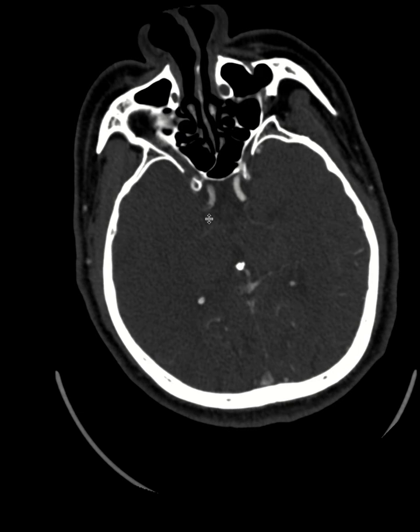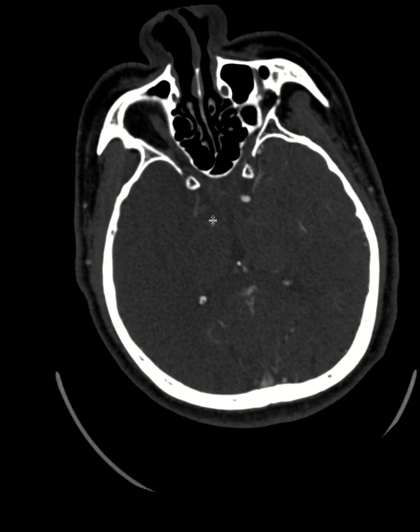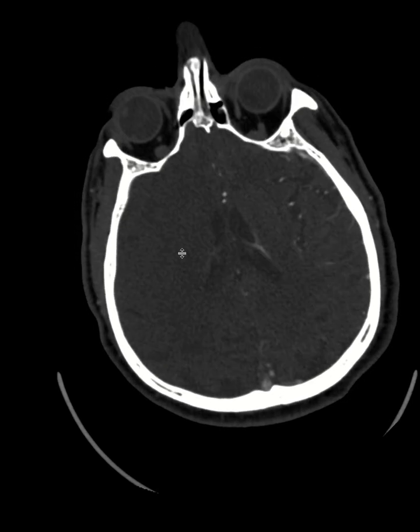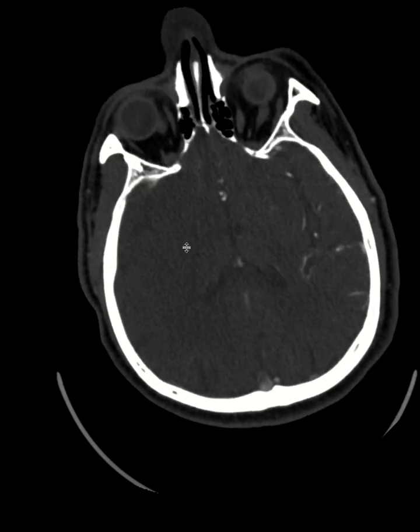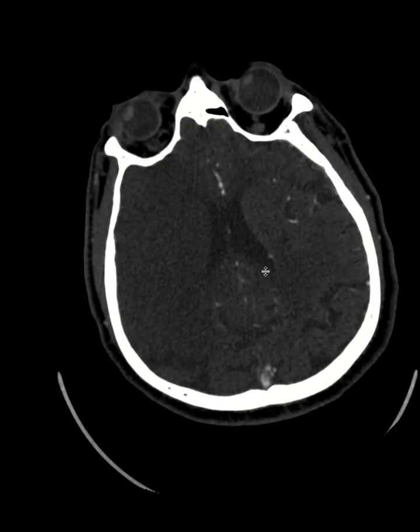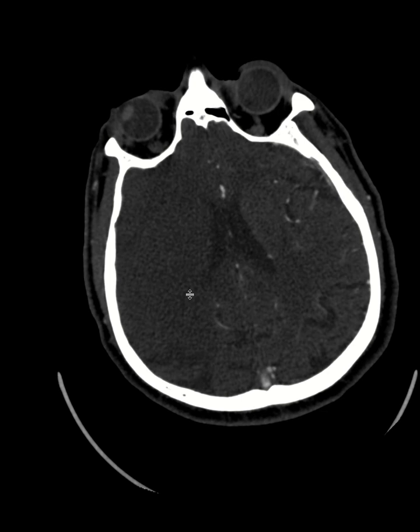And I see an abrupt occlusion or cut over here. You see that? This is just a cut. So the MCA from the very proximal is gone. And then you don't see anything coming down as M2 superior division or inferior division. And if you look at these maps, you see that the whole left side has vessels, but we see the paucity of the vessels on the right side.